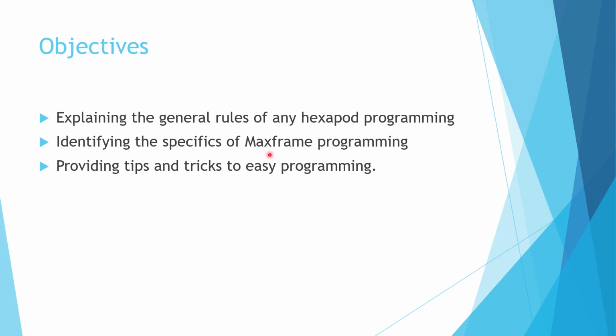And this will be obvious in the phases of correction, because most other companies do not have these phases, which in some cases is a useful adjunct to the program. And always I'm going to give you tips and tricks for easy programming.